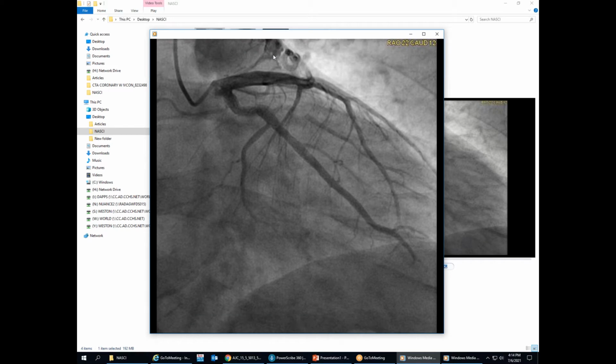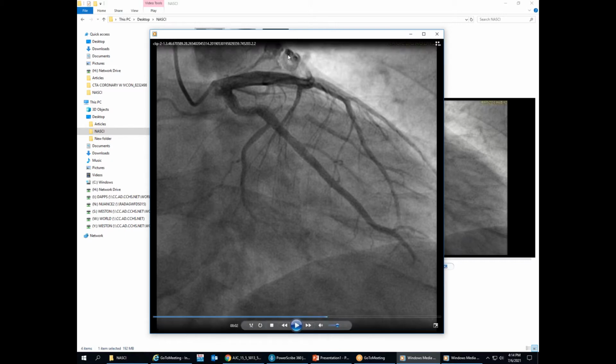There was a steal phenomenon, right? On the angiogram, you could see it going to the pulmonary artery, so there definitely was some stealing going on. Right. Which again would make sense. But I didn't get a clear picture from the notes that this is precisely the reason. Ian, can you show the first angiogram, the LAD angiogram you showed? Sure.